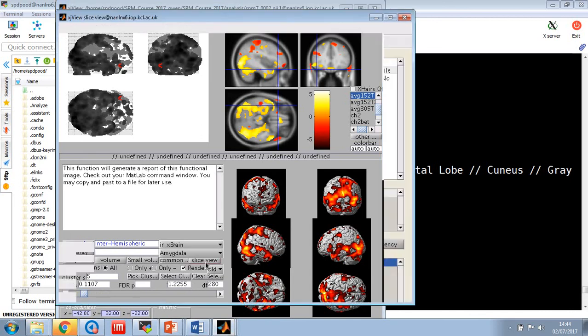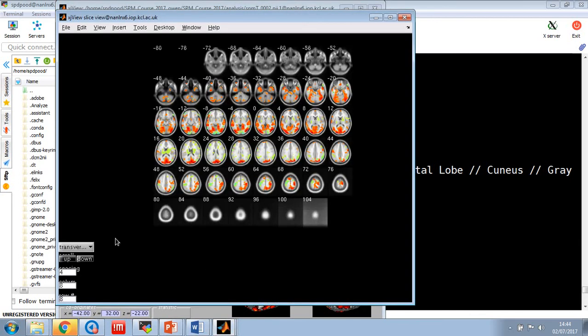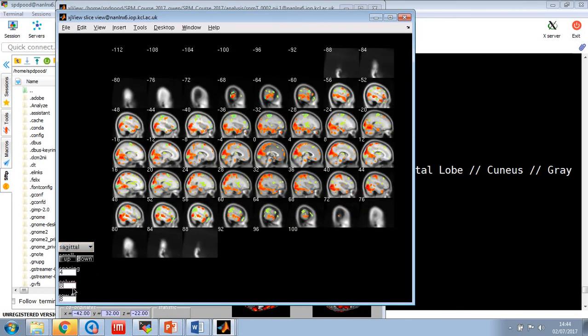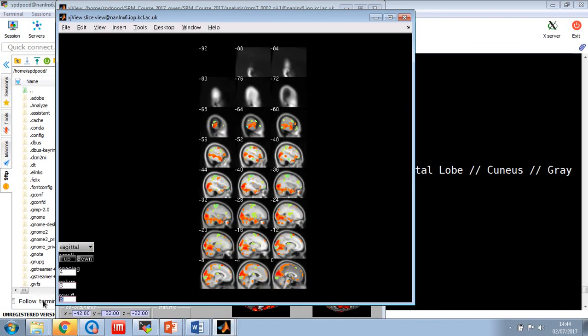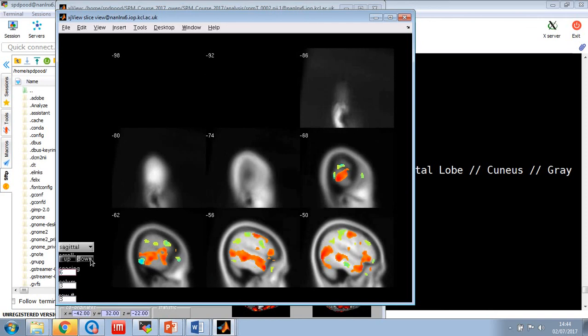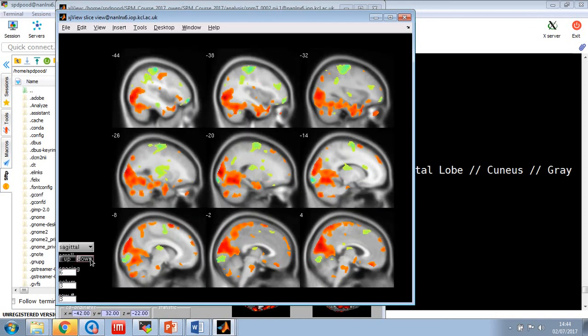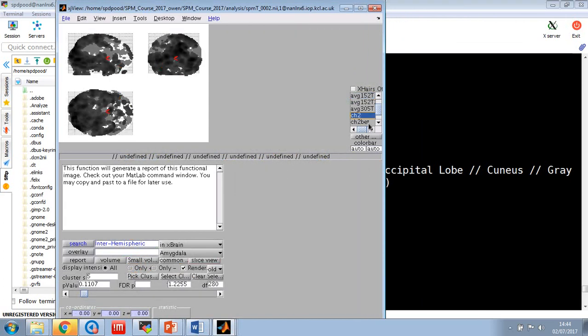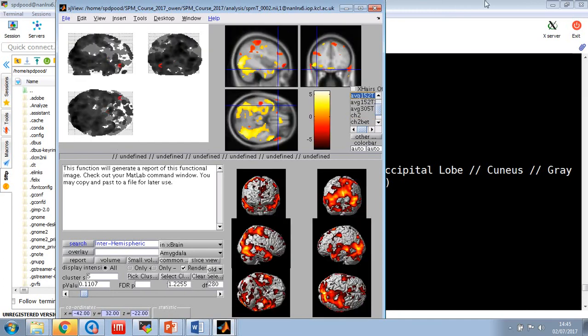You can also then click slice view, and you get coronal or sagittal maps. And you can adjust, let's say 3 by 3 rather than 8 by 8. And then say increase the spacing between the slices, for example. That's not fundamental. You can also change the brain it's overlaid onto and things like that, if it's got access to them. Okay.